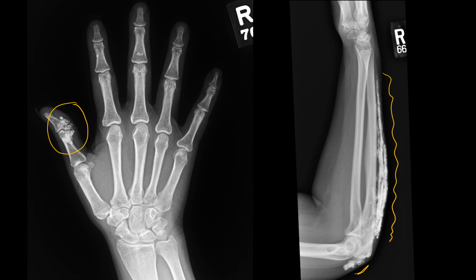So in the hand here, in the thumb next to the interphalangeal joint, this calcification looks cloud-like. They're not ossification, right? They don't have any bone marrow. It's just like calcific density, like a cloud, like chalk. And these are dystrophic calcifications of the soft tissues, and we're going to discuss a little bit about that. So we're thinking here about the differential diagnosis of diffuse soft tissue calcifications, like dermatomyositis, scleroderma, and other systemic illnesses that can give you these dystrophic calcifications.